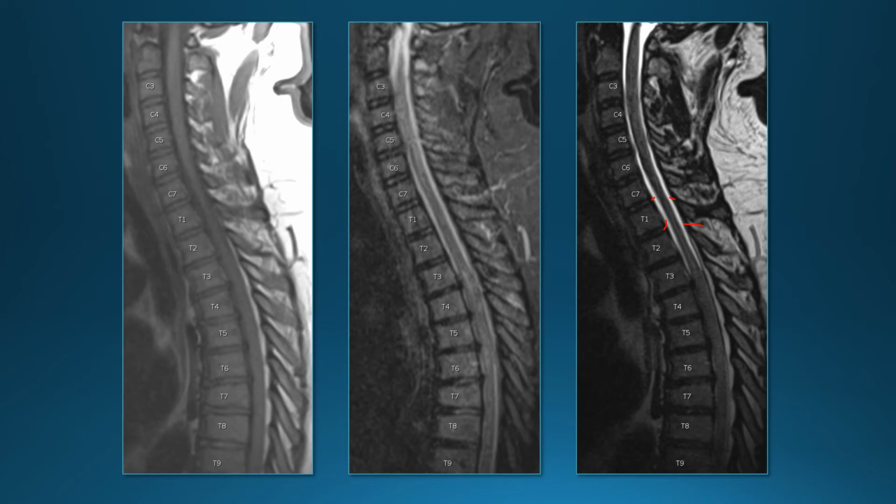And then when you get into the thoracic region, it looks like the cord is expanded here. So that we don't see the CSF in front and behind the cord anymore. On the STIR images, there is some increased signal in the cord here, but it doesn't look like there's obvious cord compression. It looks more like the cord is expanded. So does the patient have a primary intramedullary lesion? It was a little bit unclear.